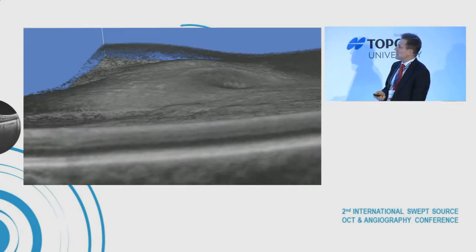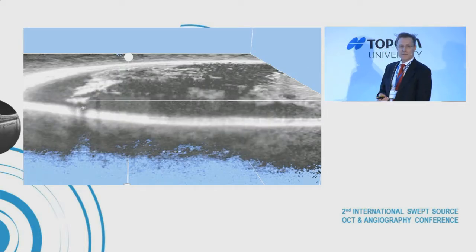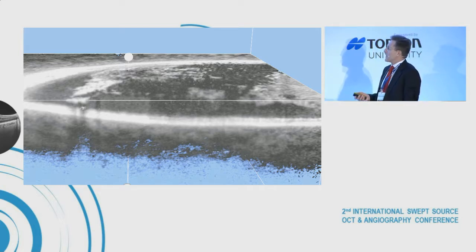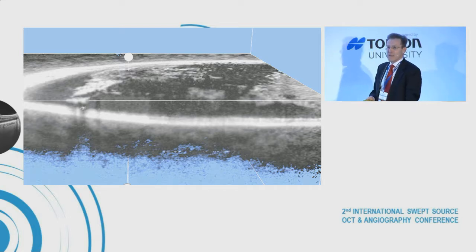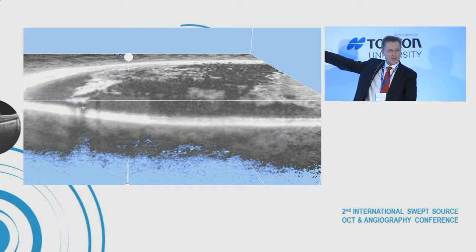And now let's see it from outside before we creep into the cave. And there's a nice illustration of the foveal depression and the vitreous detachment, partial as it is. And now we have cut the top of the retina, and we look into the cystoid edema, which appears here like it is connected spaces. I'm not sure that the resolution is high enough to prove that point, but there's certainly a lot of fluid, and it's all coming from that structure in the middle with the high reflectivity.